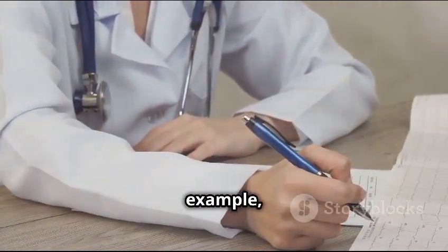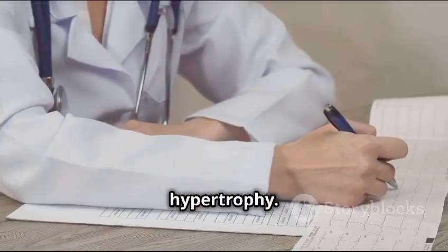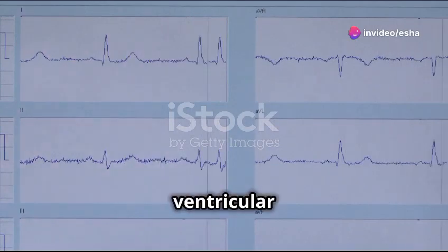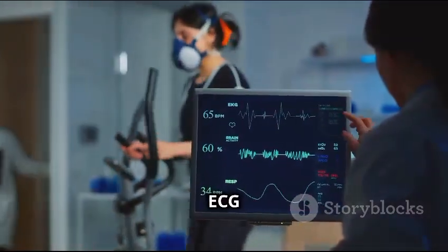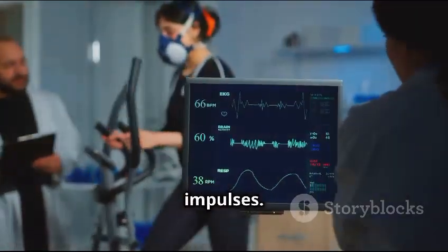For example, a left axis deviation might indicate left ventricular hypertrophy. A right axis deviation could suggest right ventricular hypertrophy or a pulmonary embolism. The intervals and segments on the ECG tracing provide information about the timing of electrical impulses.